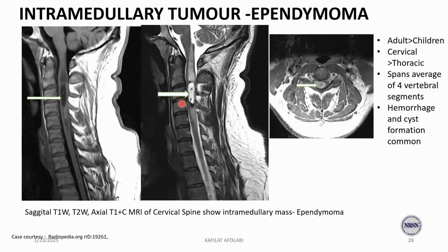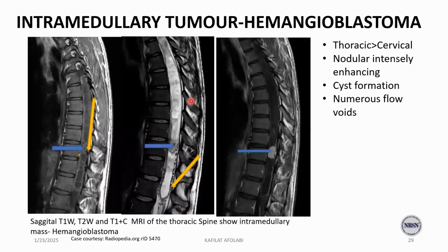And we can also see on the T2 weighted image, we have an area of hypointensity. So for ependymoma, formation of hemorrhage and cyst formation are more extensive than what we see in astrocytoma. And it generally is a more well-defined lesion, like you can tell the upper from the lower margin, especially post-contrast administration. And these findings help to differentiate the two.